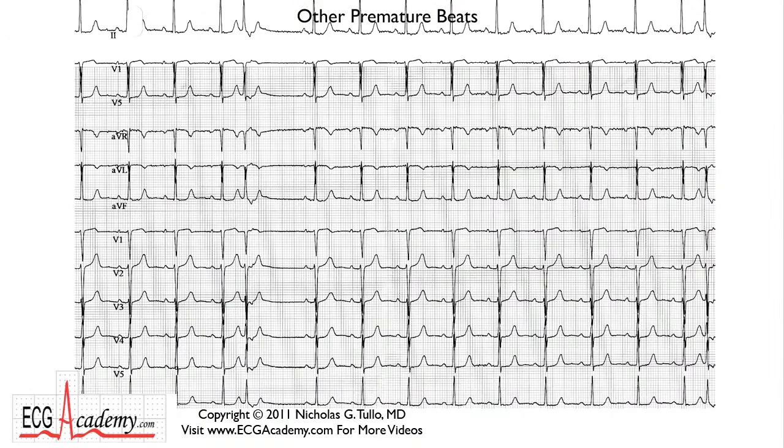Now, here's a 12 lead. It's kind of set up differently because you've got all the leads kind of like, it's almost like a rhythm strip.